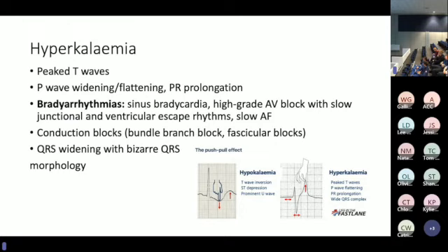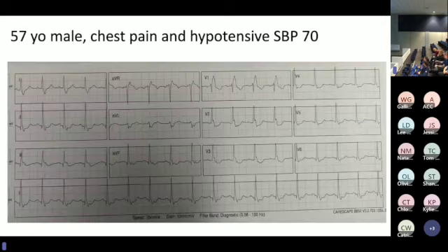Any questions about that one? I like the description that the T wave would be uncomfortable to sit on. I like that. Yeah, and if anyone is a fan of the ECG Weekly, anything that looks bizarre and unexplainable, just always think about potassium. Okay, next one.